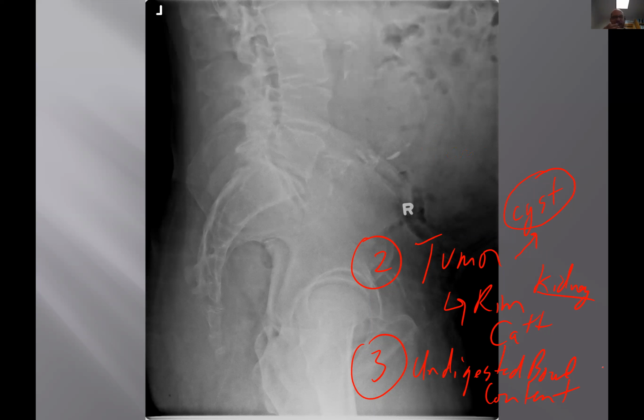But so we have to have 3 possibilities, 3 DDXs. Or else we get lazy and we begin to do slam dunk radiology, aneurysm, fibrous dysplasia. And I think we're safer if we think, okay, that looks like an aneurysm. Now, what could I miss here? Let's check it out. But you're right, this is an aneurysm. Very good. This one measured 7 centimeters.